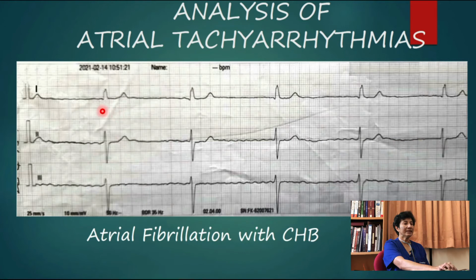These are the atrial fibrillatory waves. When there is atrial fibrillation going on, this patient has coexisting complete AV node failure, that is complete heart block.